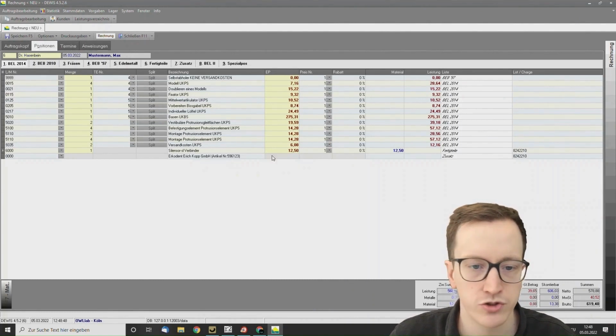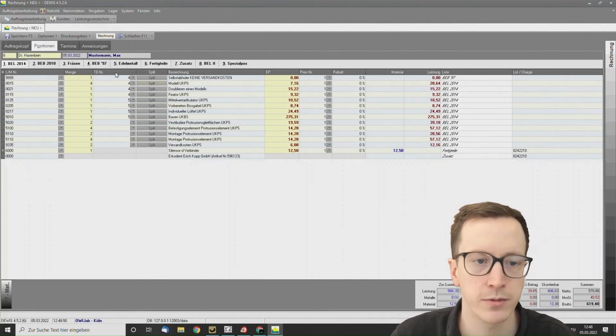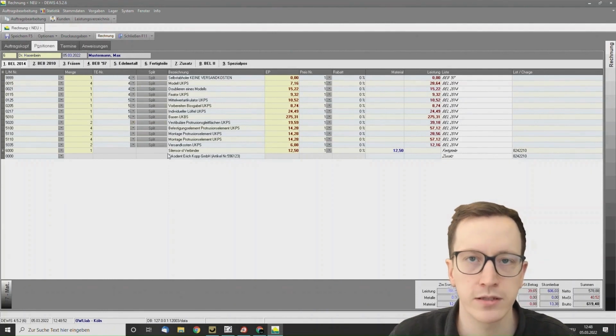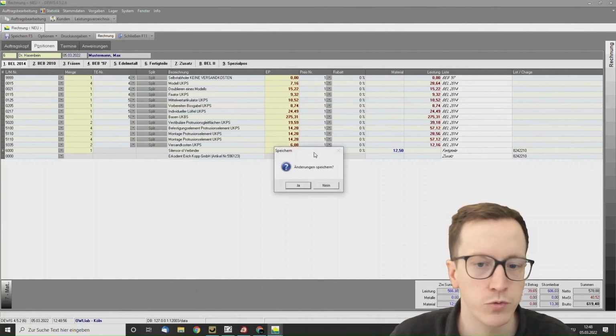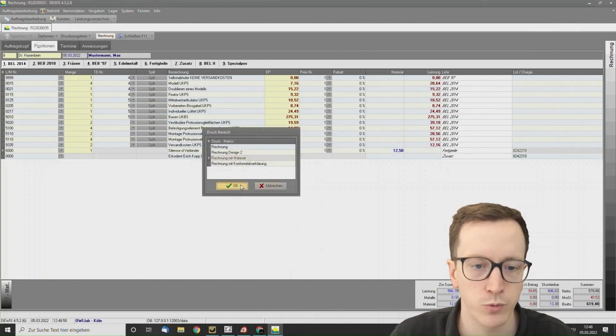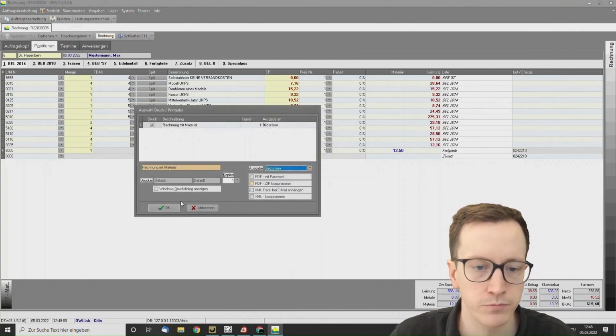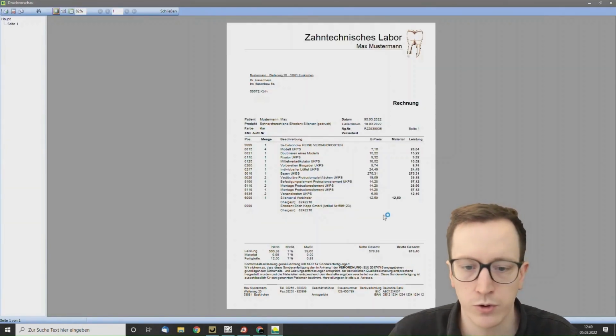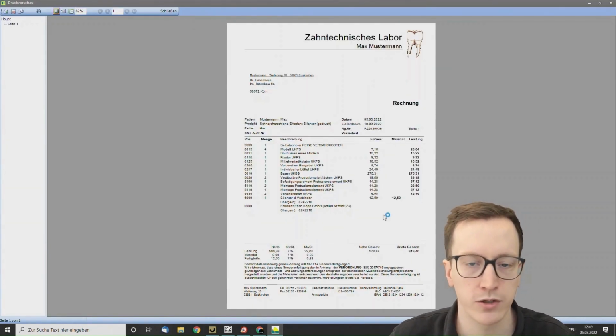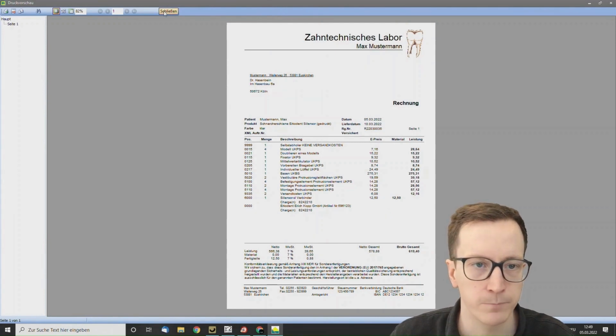Here are also the batch scans. That means in the software, I might add the missing technicians occasionally, and then I would be able to generate an invoice already at this point. Also with the utilized batches, depending on your preference, it can be displayed or generated at this location.